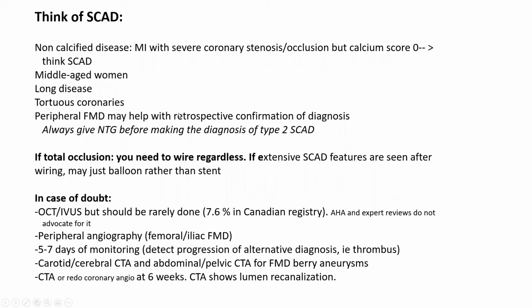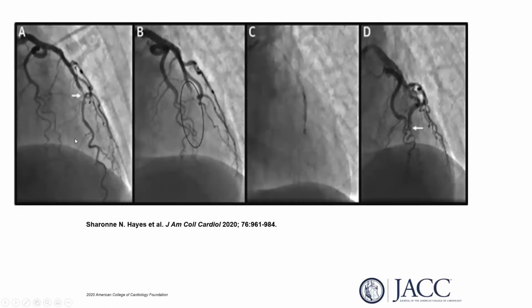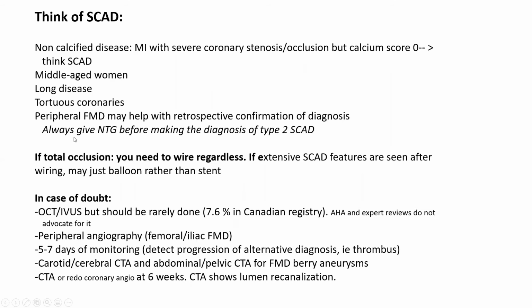Now, here's the problem I have. The biggest problem for me in terms of SCAD, the approach may be well delineated in terms of management, but the biggest and toughest problem is that the diagnosis is solely and exclusively based on angiographic lesion morphology, on the angiogram overall, and on the context. So a lot of us feel uneasy observing tight stenosis without definite diagnostic confirmation. So we need to know very well all the clinical and angiographic clues as follows.